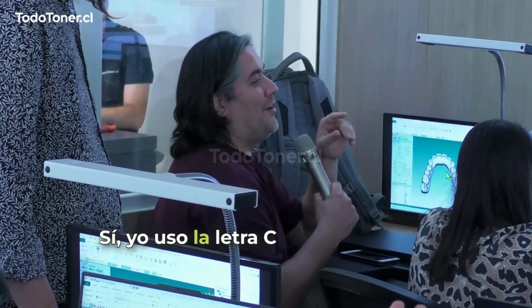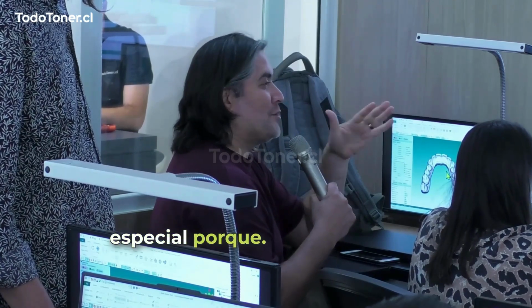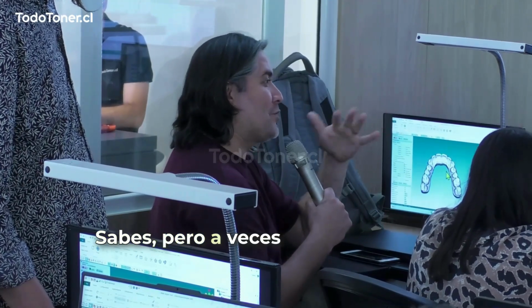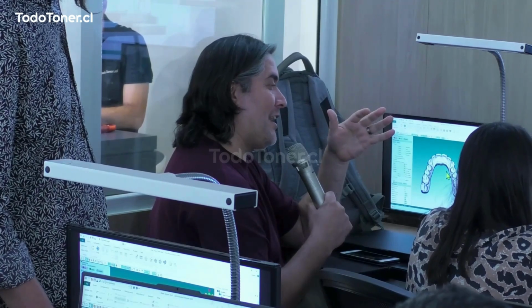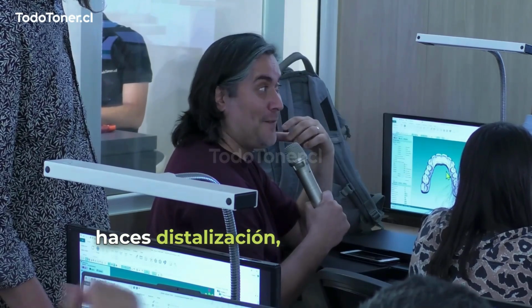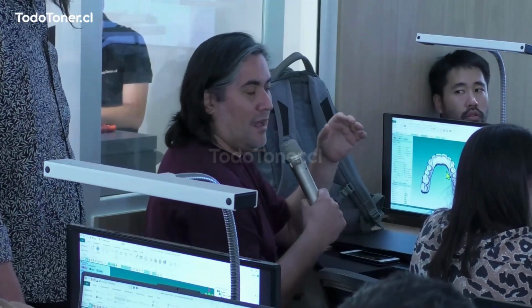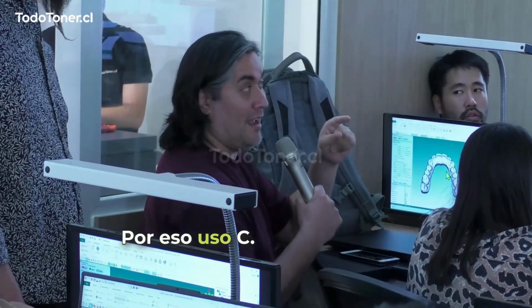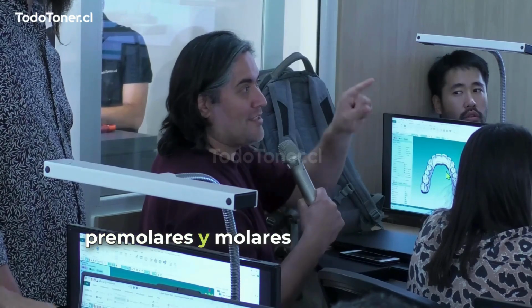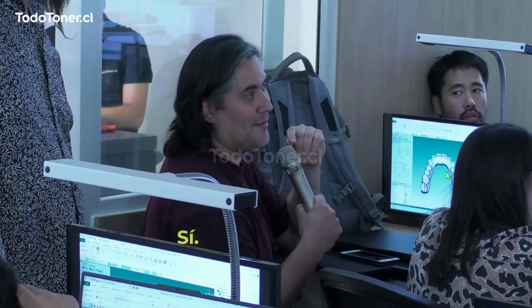I use the C letter special because the first 4 aligners are scallop. Yes. Yeah, you know? But sometimes also the first aligners, especially when you do distalization, you need to have a straight and extended one. Right. That's why I use C, and I modify only premolars and molar straight, and then canine to canine scallop. Right. Very nice.